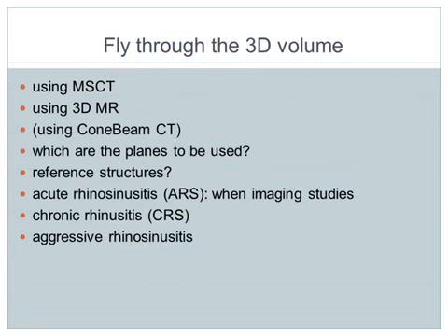The planes to be used, of course, since we are dealing with a three-dimensional structure, it is important to navigate and fly through this volume in the axial, in the coronal, and in the sagittal plane. Then there are very relevant reference structures that should be a landmark for the surgical approach by means of endoscopy, and these should be demonstrated by imaging and pointed out in your report.